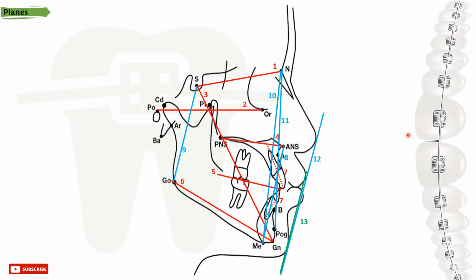Finally, after pointing all the skeletal, dental, and soft tissue points and connecting some of them to form many horizontal and vertical planes, you will pretty much end up with something looking like that before we start to measure some lengths, percentages, or angles.